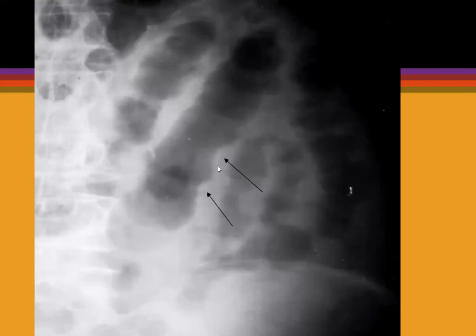This is large bowel, this is descending colon, that's transverse colon, that's descending colon, that's the beginning of sigmoid colon. And you can see the wall is thickened and it looks like a thumbprint. Someone's pushed their thumb into the bowel. But actually this grey area is just thickened wall, and this is air within the colon. Really important to identify this on an abdominal x-ray.